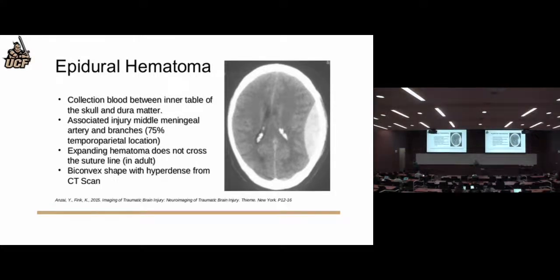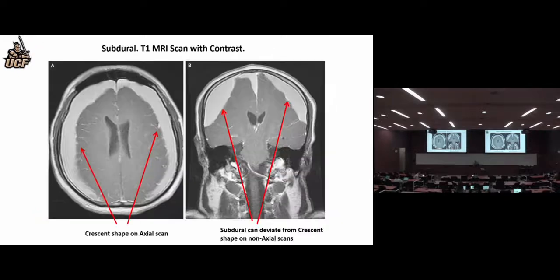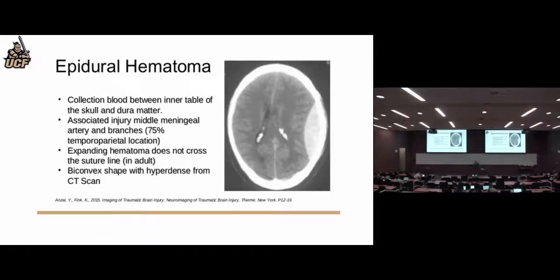Well, hopefully everybody that wants to come back is back. Here we're back at the epidural hematoma again, at which point I jumped into the more basic stuff. So there's your subdural, there's your epidural.